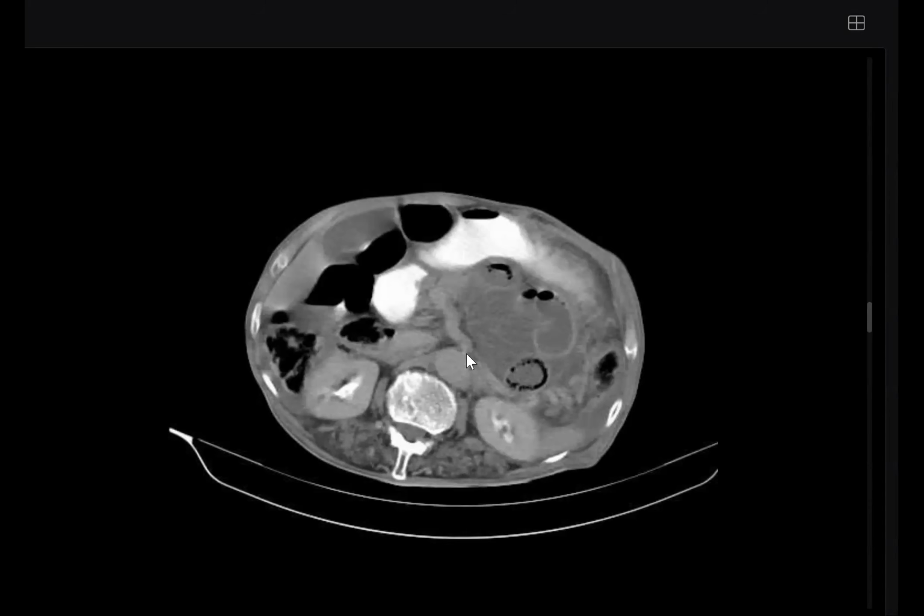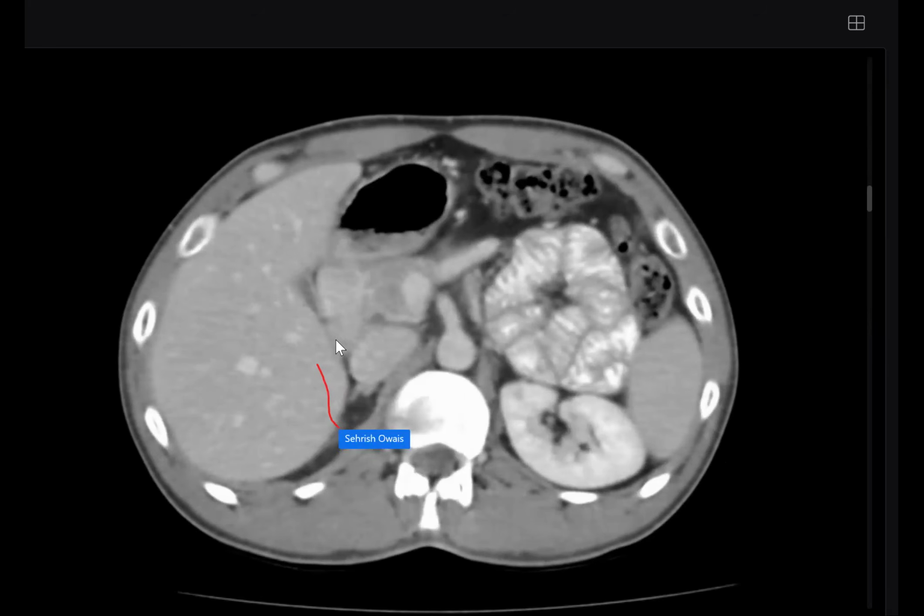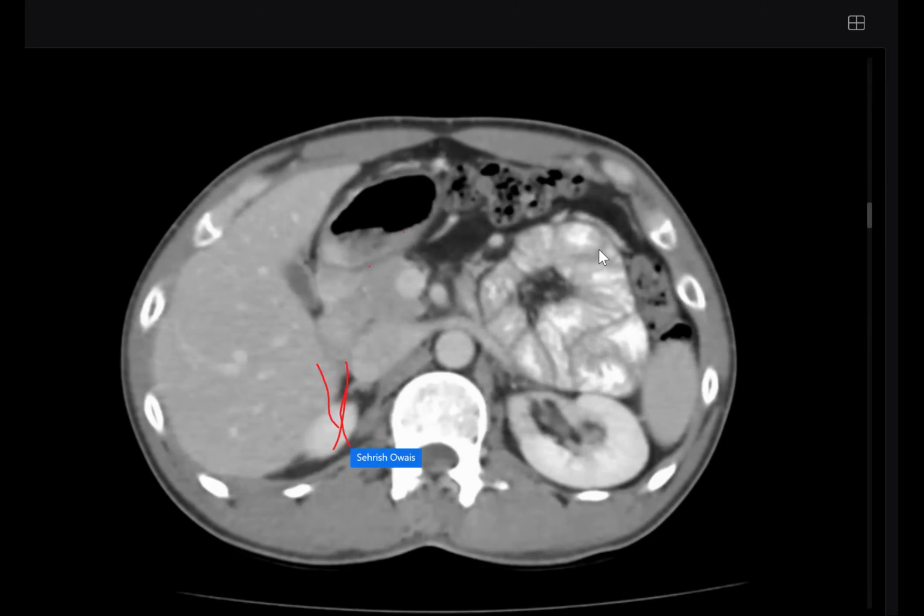Sir, it can be paraduodenal. Okay. Anyone can answer yes or no? Paraduodenal hernia, yes or no? I know it's a difficult one. No problem. Yes, so all of you said yes. Okay, no problem. The next one. What type of hernia? Is it paraduodenal? Yes or no?